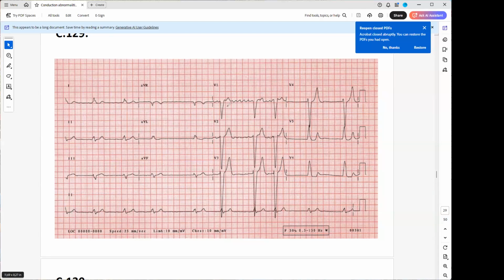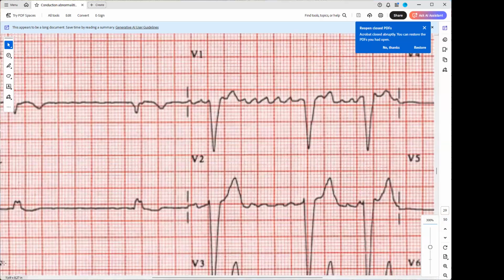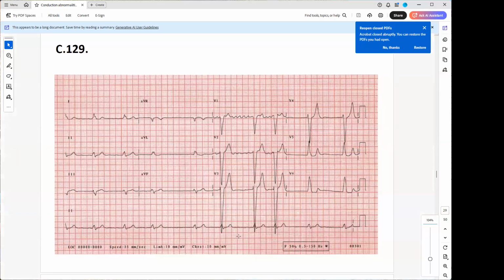By looking at V1, it looks like an atrial flutter because you do see some kind of undulatory wave here. However, look at the rate. This is more than 350. It's less than one square. If you had one square, it means 300, but this is faster than 300. And the flutter should be less than 300. If it's faster, that means we do have fibrillation. Exactly. So that's an atrial fibrillation. Very good. And this is arrhythmic.